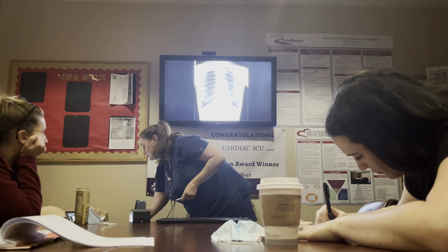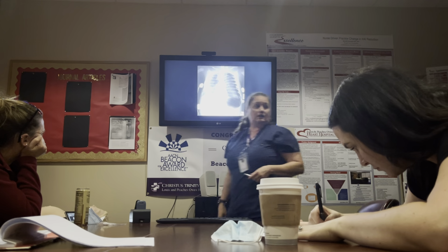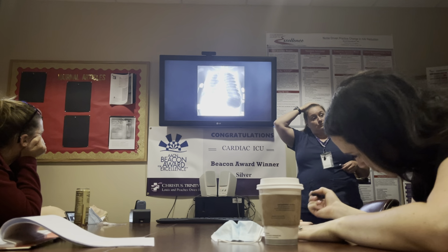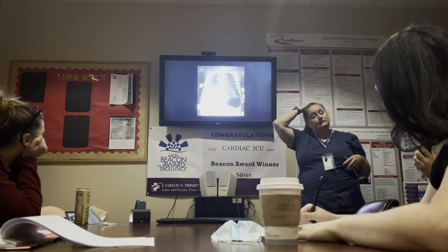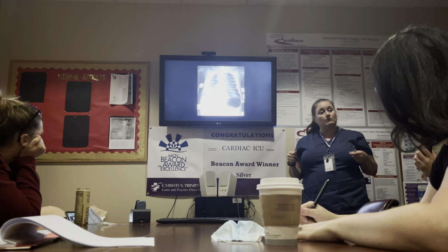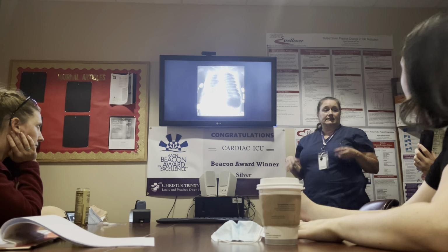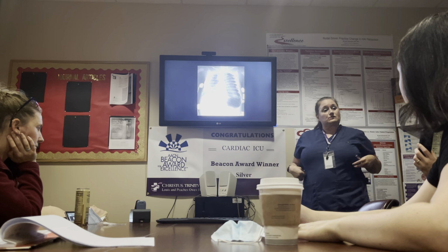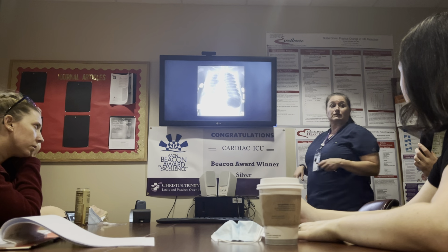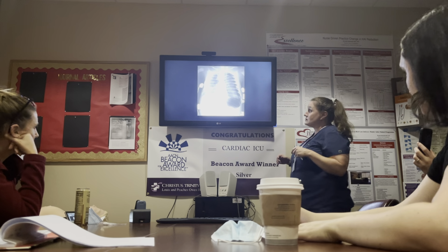So that deep sulcus line, is that something you would typically see with a pneumothorax? You can see it with a pneumothorax, and sometimes that's the only thing that you'll see with a pneumothorax. Because if it's an anterior pneumothorax, you'll be able to see the full lung, and it'll rattle your cage because you know that there's something going on with them. Their peak pressures are different, they're hypotensive, whatever. And you look at it and you don't see it because the lung is fully expanded. And sometimes you'll just see that slight sign, or you'll see some pneumomediastinum or something along those lines, and that'll be enough to tell you that something else is going on and that you may have to do a scan to make sure that it's where it's at, so that you also position it right. Okay.